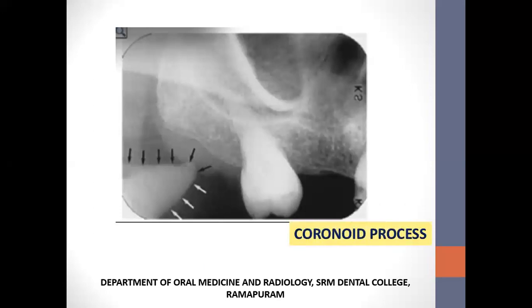This is the only landmark of the mandible seen in a maxillary IOPA, which is the coronoid process. The image of the coronoid process of the mandible is frequently evident as a triangular-shaped radio-opacity with its apex directed superiorly and anteriorly, superimposed on the region of the third molar near the maxillary molar region. In some cases, it may appear as far forward as the second molar and be projected above or below these molars depending on the position of the jaw and projection of the X-ray beam.